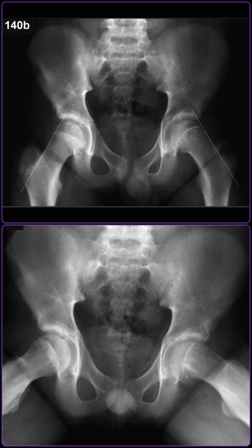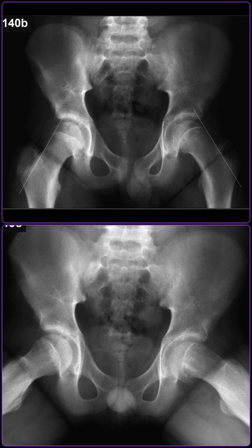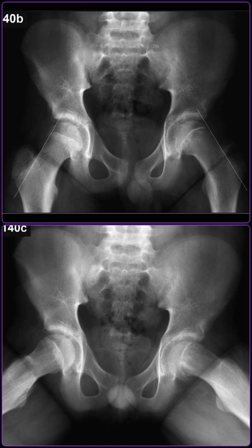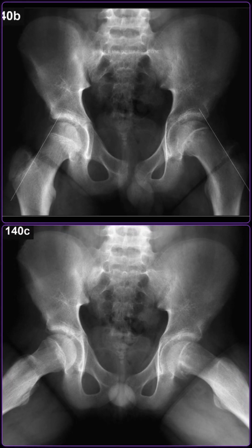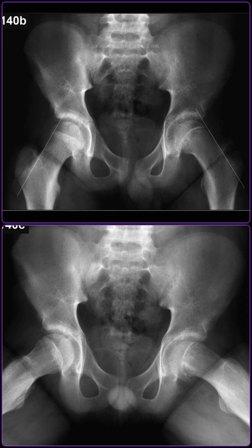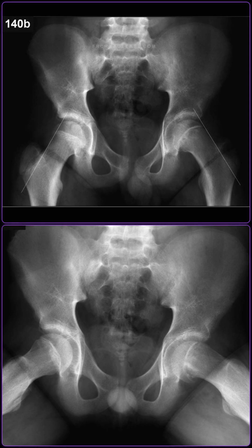A frog lateral projection is mandatory because the epiphysis slips posteriorly and medially, meaning the slip is often seen first on the lateral view. Relying solely on the AP view can lead to a delayed diagnosis, increasing the risk of severe complications. Discuss the potential complications, treatment options, and how you would manage this patient as a radiologist.